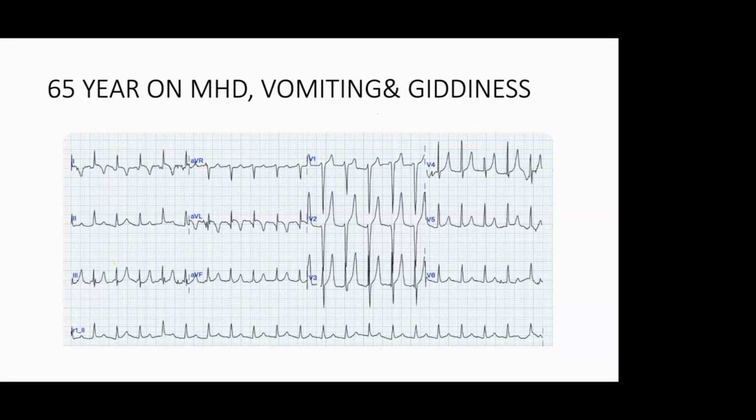It's like a pulled up T wave. It's not broad based, it's not like a dome. The first difference is that it's not like a dome. It's like a peak, a point, pinch like. Then the QRS height will be preserved. There will not be a Q wave like that.